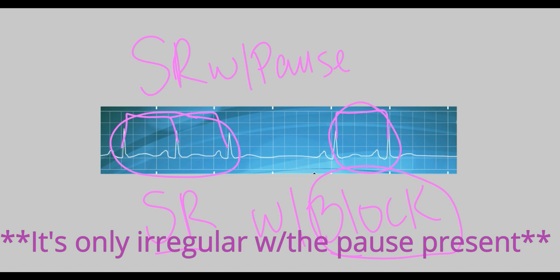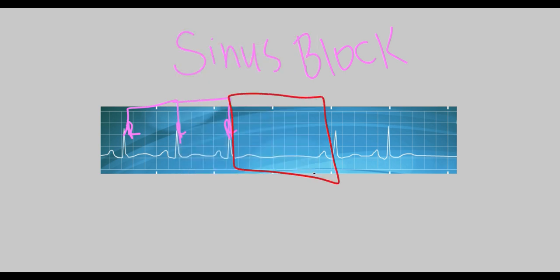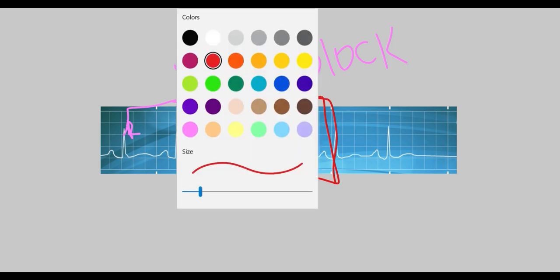And let's delete all this again. Okay, so I know this is a sinus block and not a sinus arrest because we measure two consecutive R to R's. So 1, 2 is going to equal this pause. Wish I had calipers so I can show you, but it's going to equal this pause right here. So it's going to be equal to this.